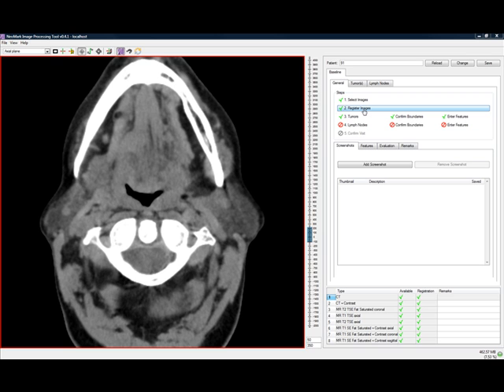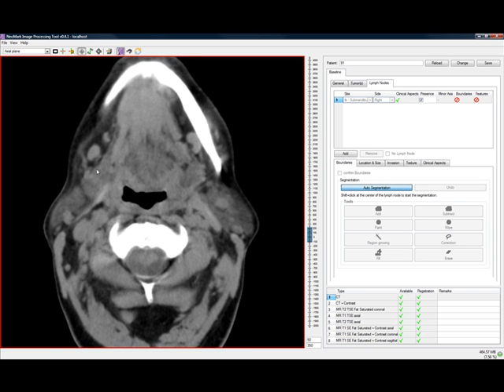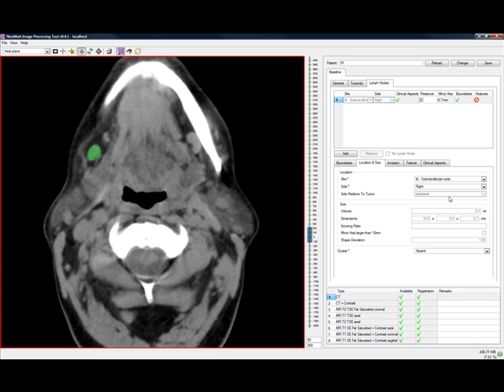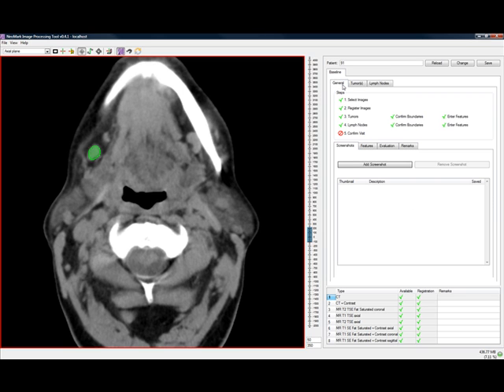Once all images are aligned, the user has to identify the target structures, tumors, and relevant lymph nodes. For lymph nodes, the boundaries are determined automatically by a single click in the center. Upon confirming the boundaries, a 3D model is created from which geometry as well as texture-based features are extracted. The geometric features include the volume, the axis in three-dimensional space, as well as the shape deviation. For the texture features, the Hounsfield unit variance, the contrast take-up rate, and the amount of necrosis is identified. Further properties, like the invasion of surrounding tissue, have to be entered manually.